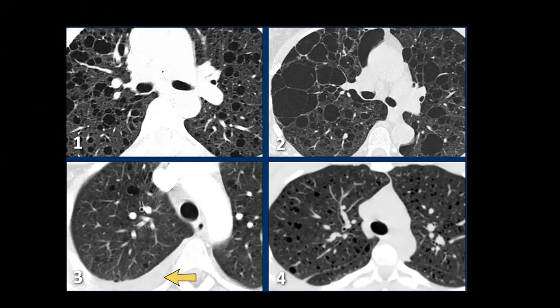This is a lung window of HRCT, with multiple cysts with thin walls seen in bilateral lung parenchyma, throughout the lung parenchyma. It won't be showing any zonal predilection.